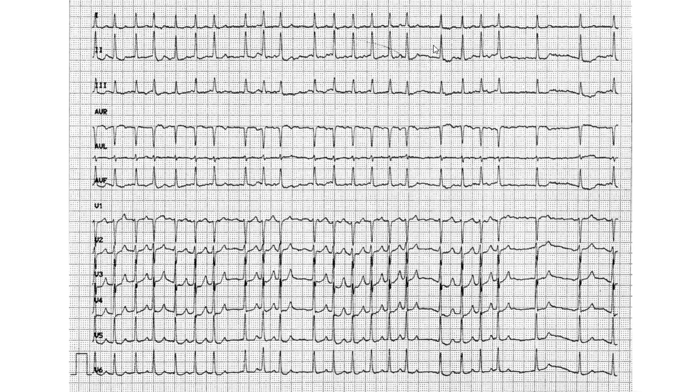So basically, we already said that it's irregular, and we said that we don't see P waves, and this is definitely not a P wave because it's like 3 in a row. So there is no such thing as 3 in a row. So this is going to be fibrillation. Point 3 is heart rate. It's going to be tachycardia.